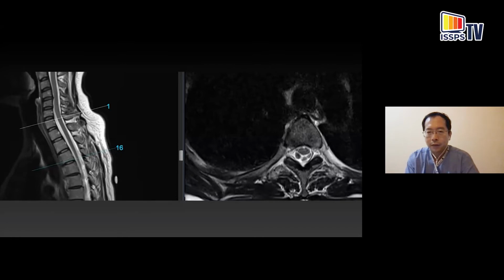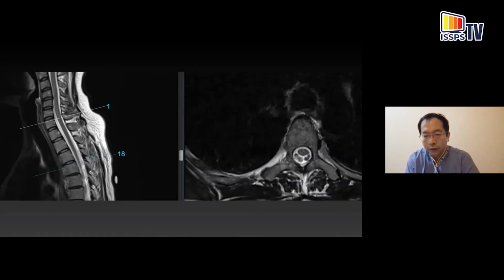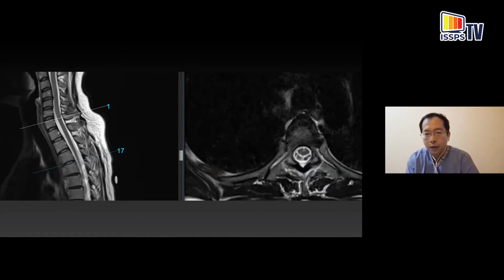So this, sometimes for radiologists, represents a little channel through which we can access the intervertebral disc. It's this space which is relatively devoid of large vessels, because this is the upper part of the rib. But once you move slightly inferiorly again, you start to see another sliver of tissue coming in. This is already the costotransverse joint again. So very tight working space.